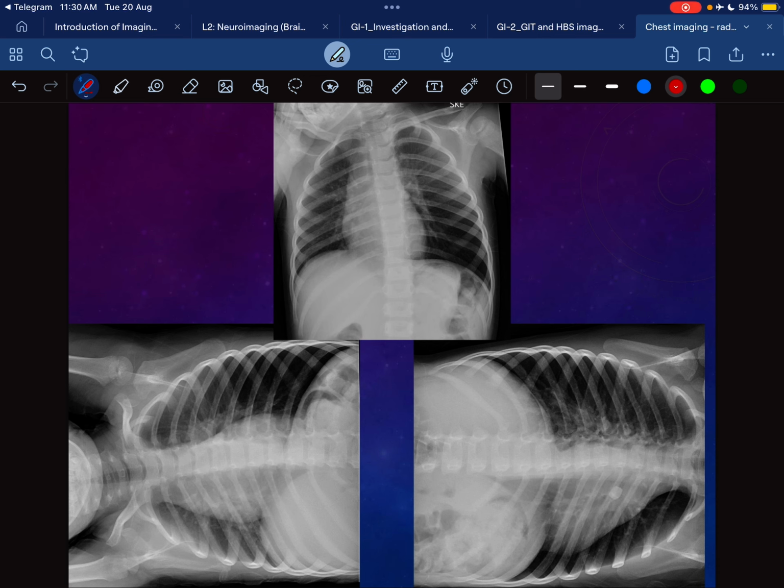If you lie on your right lung, the right lung that you're lying on will get smaller. But if the patient has a foreign body like this one, you can see there is a foreign body there. There is increased air trapping inside the lung because the air cannot leave the lung and stays inside, and that's the reason for the hyperlucency there.